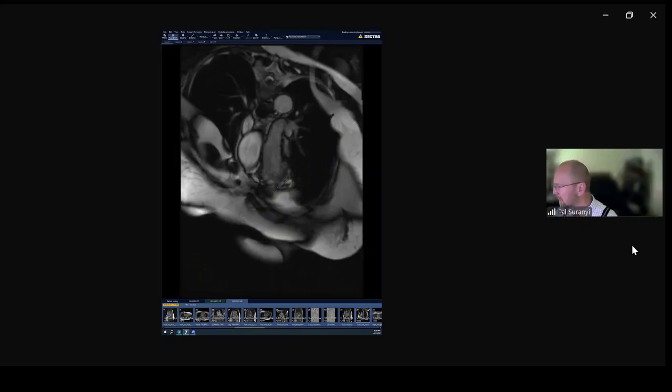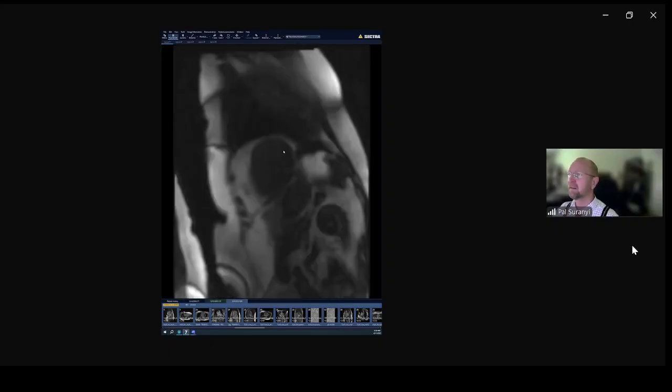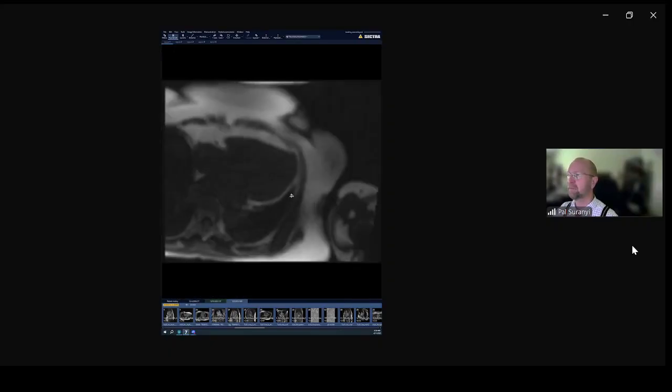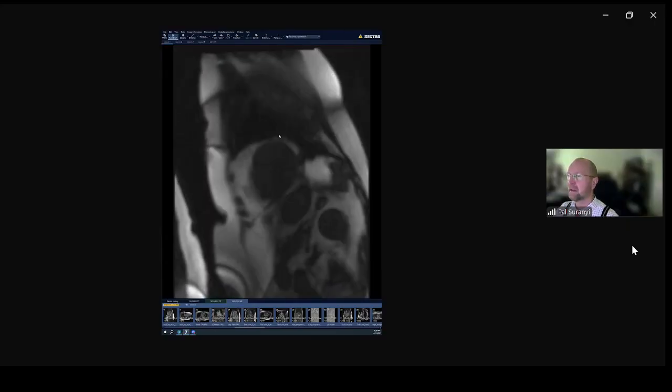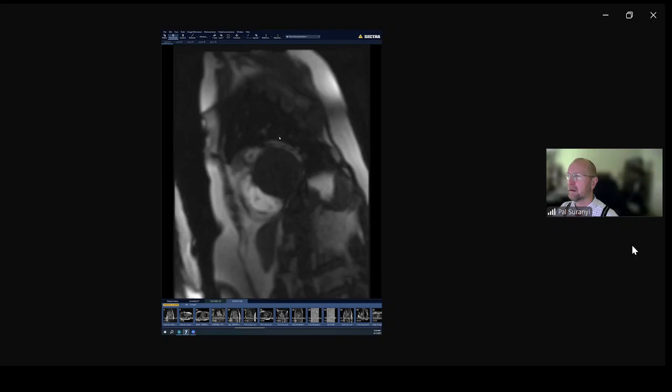Hold on a second. Hopefully I can go back to the salient image quick. Yes, this is going to be our images.